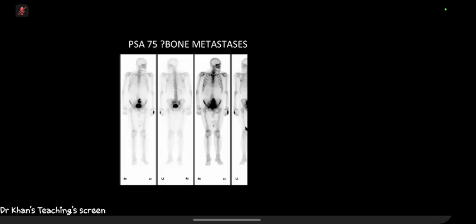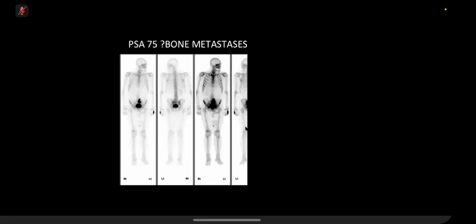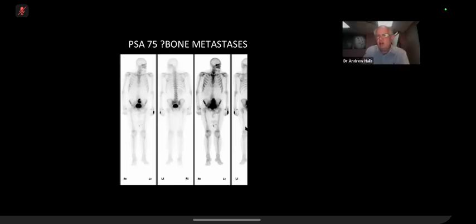I wonder whether this is exactly the same density as the bladder and is close to it. I wondered whether this could be a bladder diverticulum, but I can't get a connection. Well, I think that's quite a good idea. An oblique view could help. I can see that there's been extravasation at the injection site as well. Okay, well that's fine. I think bladder diverticulum.